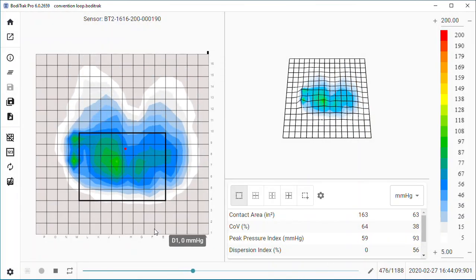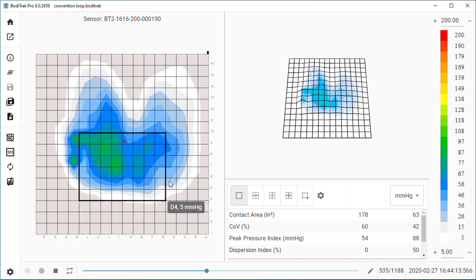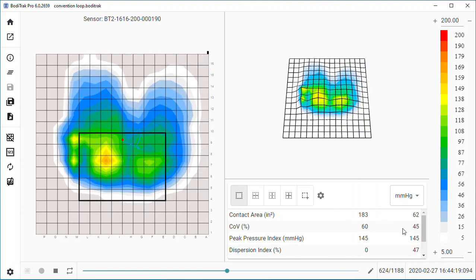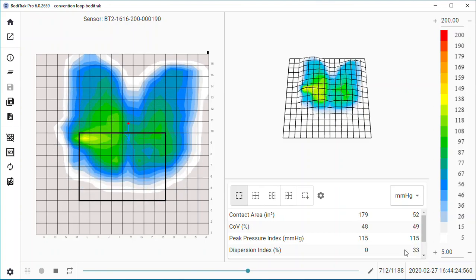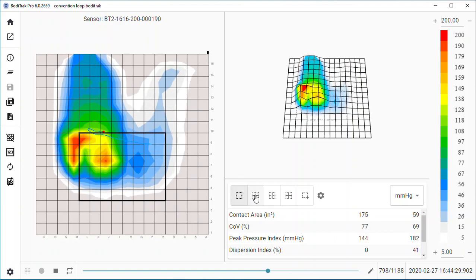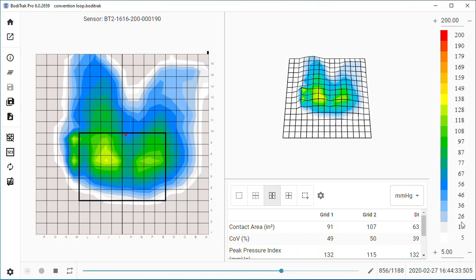On the image here, you can see it encloses the IT area and sacral area. If that area is above 50% based on the research that was done, then you are going to have potential for some tissue trauma here. And again, your 3D representation, color bar here. These are different distributions you can look at, different ways you can divide the image.